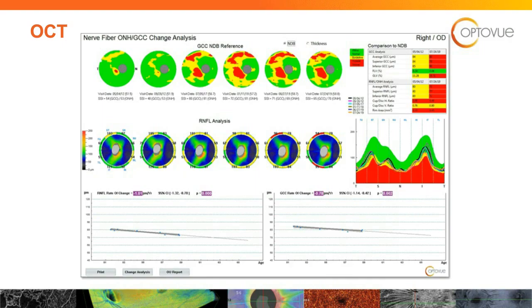All right, in the software program, where do you find the TISNIT summary plot? So in the software program, the TISNIT summary plot, if I can go back and address that by looking at the actual slide here. So here's an example, let's see if we're seeing that now. I think that you are, but let me just make sure of that.